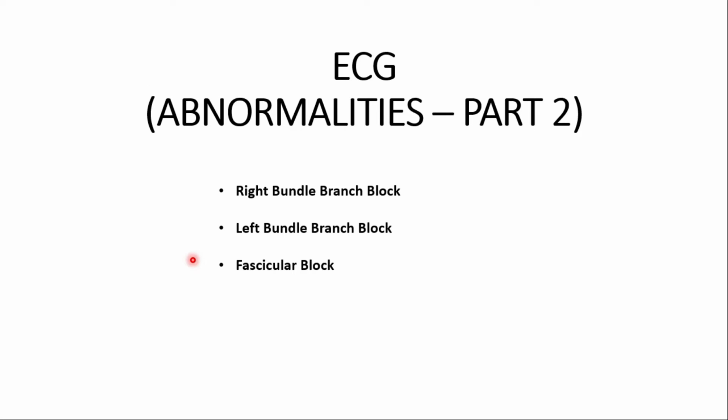Hello everyone. Today we'll learn about right bundle branch block, left bundle branch block and fascicular block patterns that are seen as an abnormality in ECG.